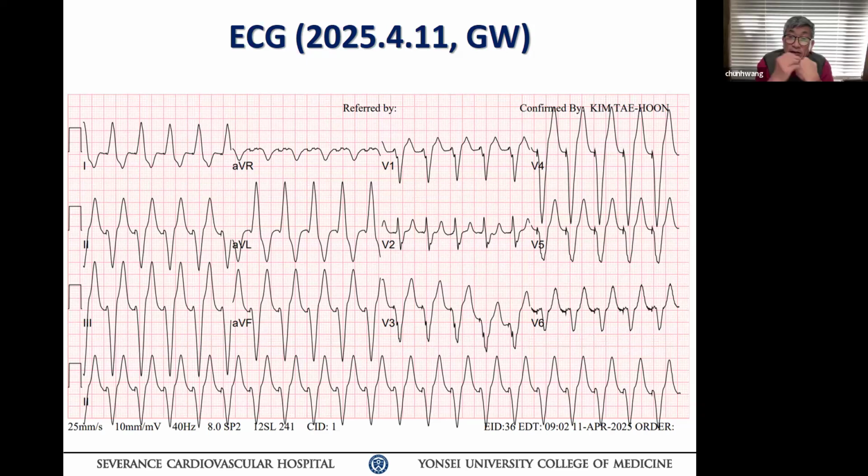What is the notching in V5 at almost the very peak of your QRS complex, coming down, following the QRS? Yeah, there's notching. Is that notching at the downstroke in the S wave, the deep S wave? And if you look carefully, that notching keeps changing. You see it? Next one, different. Next one, the next one. Yeah, Dr. Joe already mentioned it, that he has an eagle's eye.